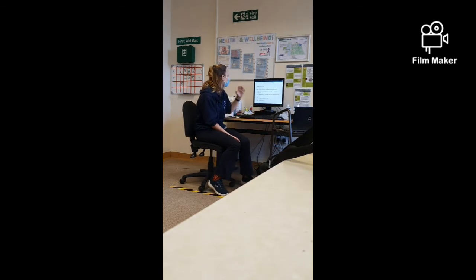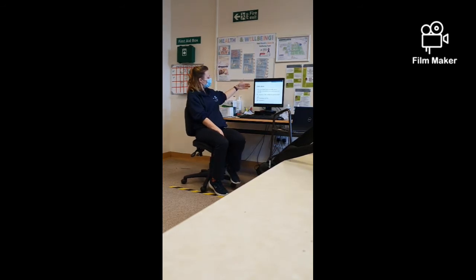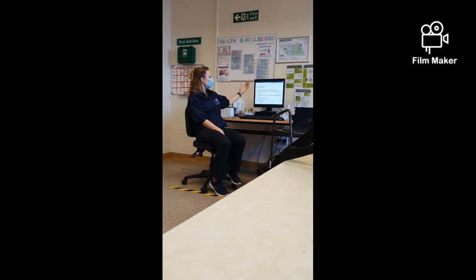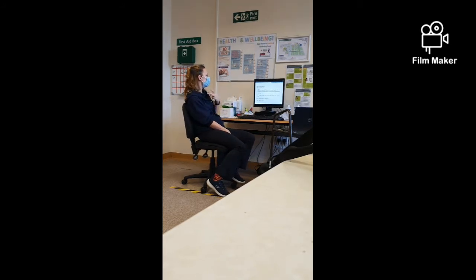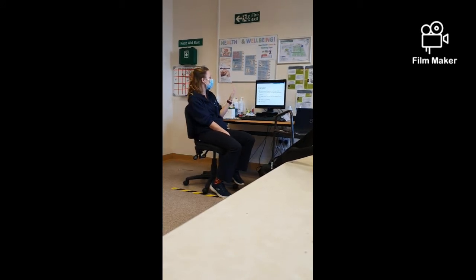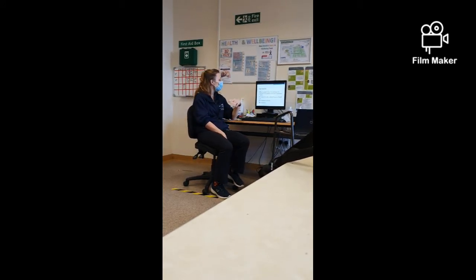Okay, and then we have to look at orientation. So they use the acronym RIPE to make sure that we've got the right orientation. So R is it rotated? You can look at the medial part of the clavicles to make sure they're equidistant, to see whether the chest X-ray is rotated or not.